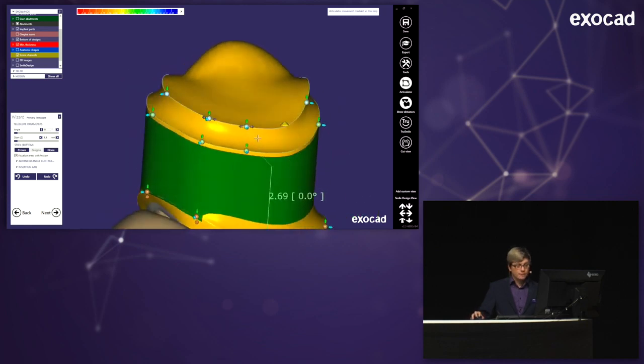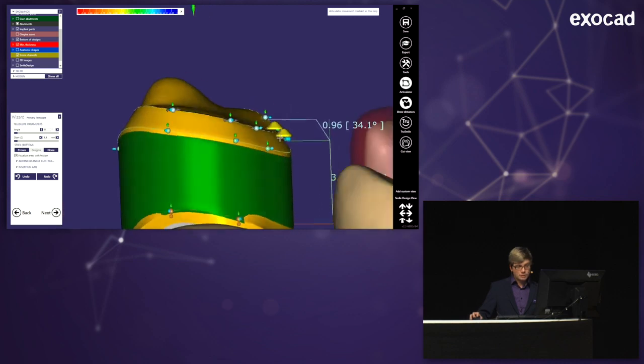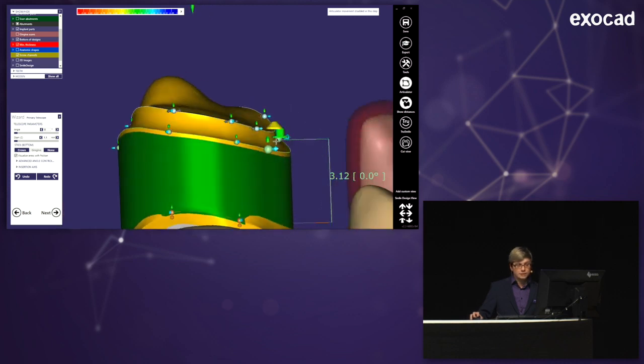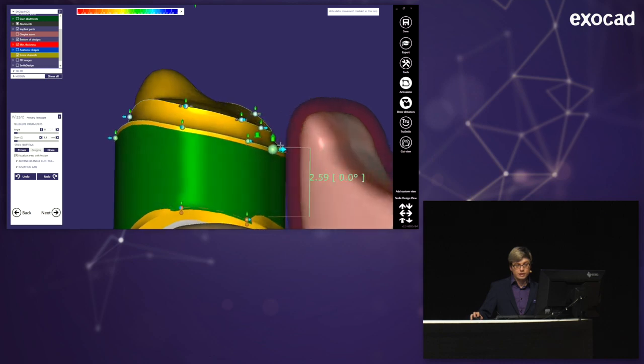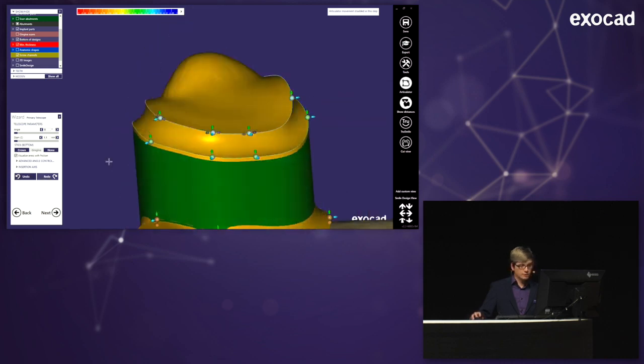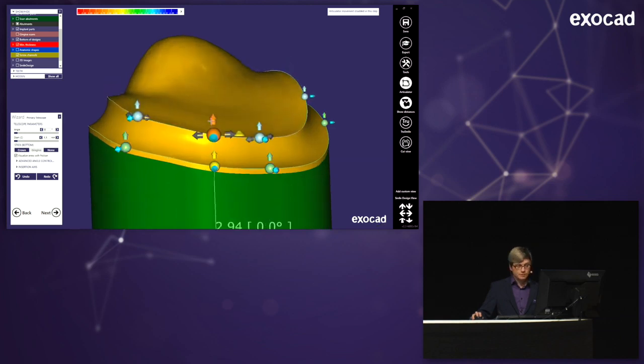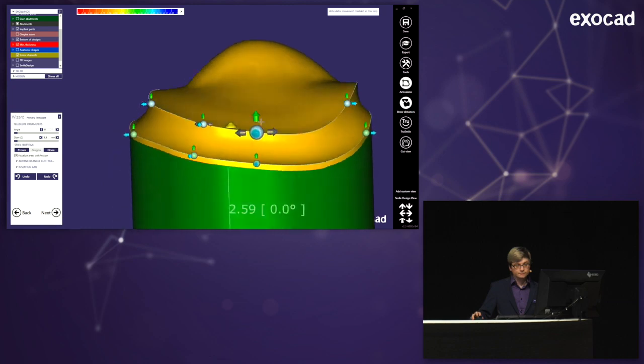Those actually show what kind of surface the area between 4 points actually is. The green one is the parallel surface. The yellow one is just a conical surface. So if I hit this, it changes. For now here, normally it's the yellow one. I'm changing it to green, so I get a bit of a shoulder because it tries to design a parallel surface here. And I'm also hitting other buttons. If I pull this up, you see the parallel surface. But for a shoulder, this is enough.